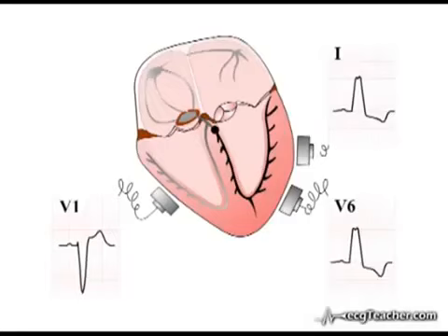These changes are an electrical phenomenon secondary to the highly abnormal pattern of ventricular depolarization and do not indicate underlying acute ischemia or infarction. Block on an ECG is a highly abnormal finding. Significant damage to the left bundle branch is commonly seen in infarction secondary to obstruction of the left anterior descending artery. And new onset left bundle branch block may be the presenting ECG abnormality in a patient with anterior MI.